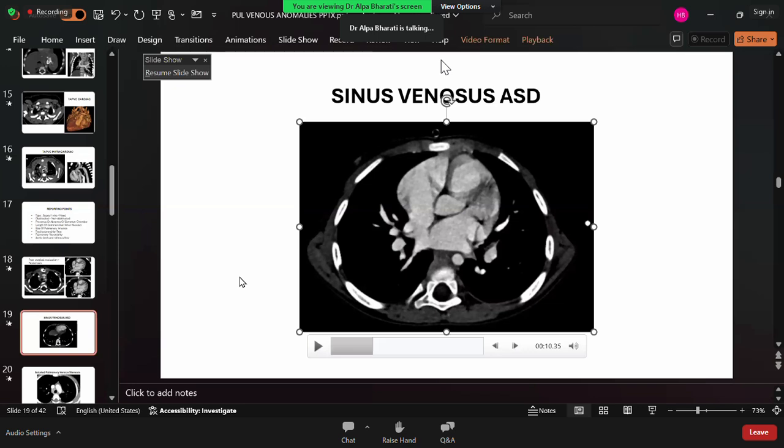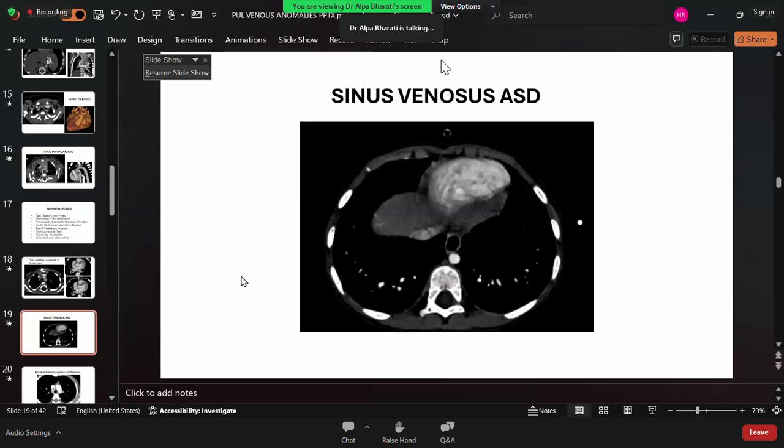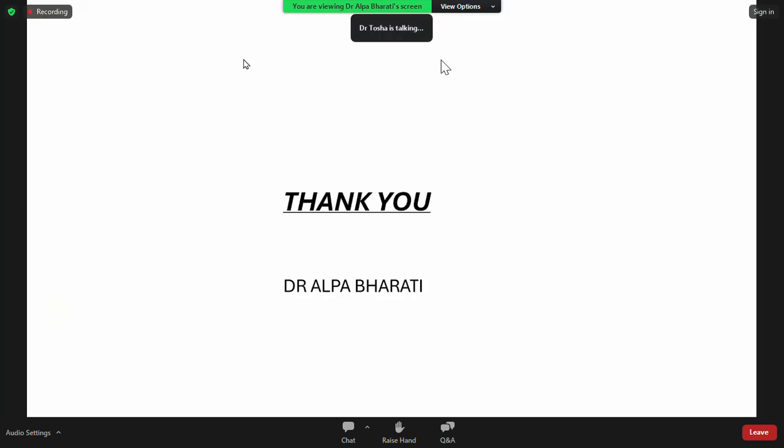Any particular question, any particular doubt that you have regarding sinus venosus ASD, which is confusing, then maybe I can point that out, or this helps you. I think it should suffice as of now because another person has also asked, can you show the sinus venosus defect? So we just did that. Somebody has asked about the MPA and right and left pulmonary artery normal size. That also has been taken.